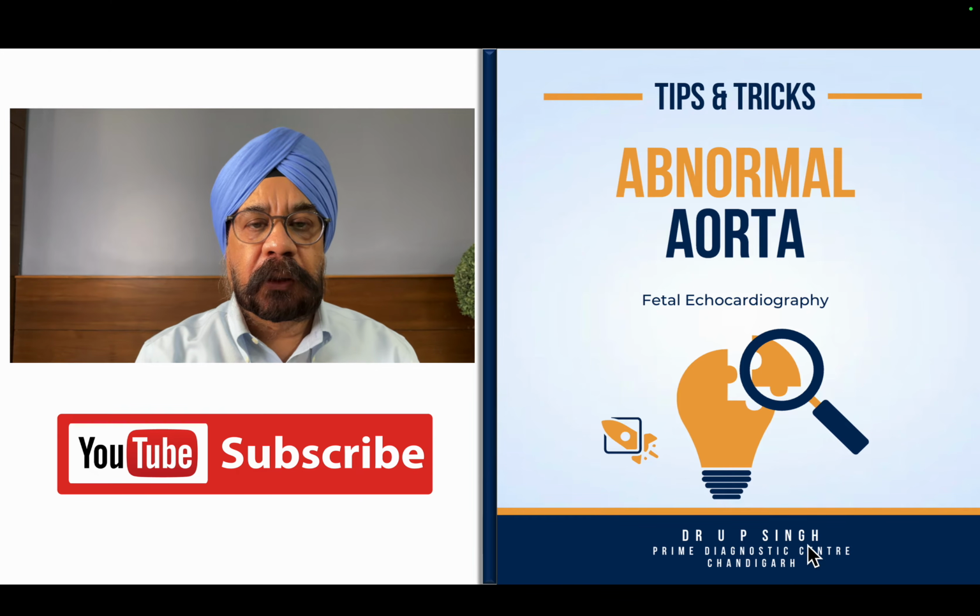Talk delivered in Chandigarh only, that is of the fetal aorta, and how do you make an assessment by echocardiography, fetal echo.